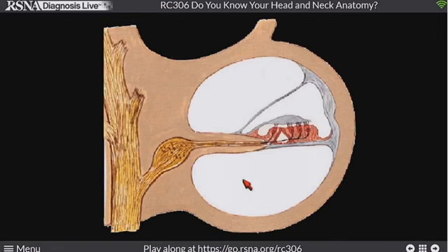In the cochlea itself, we have these different chambers. We have the modiolus, the bow tie in the middle of the cochlea, and these three main chambers that we discuss in the cochlea. The top of this one is flat like a tympanic drum, so that's scala tympani. This one is kind of shaped like a V on top, so that's scala vestibuli. And this guy is in the middle, so he's scala media.